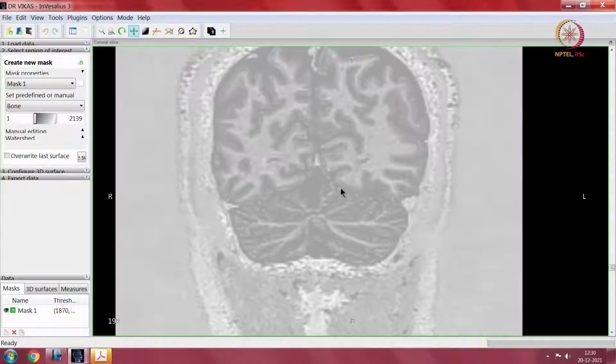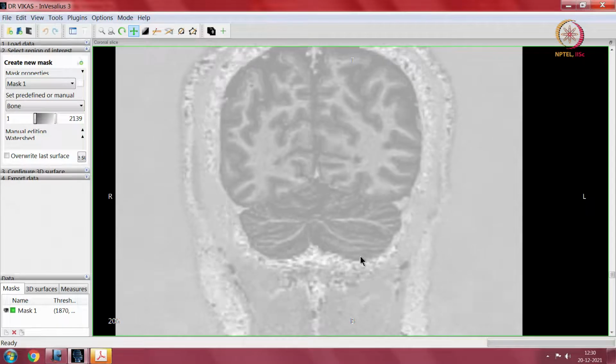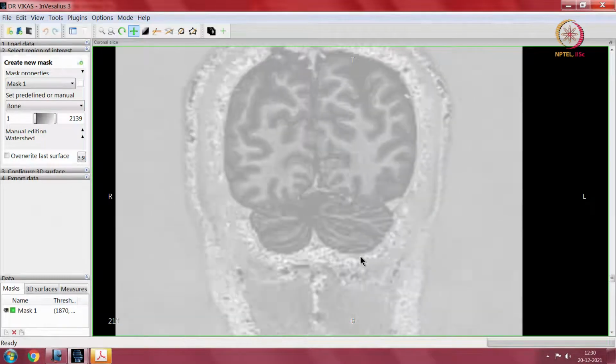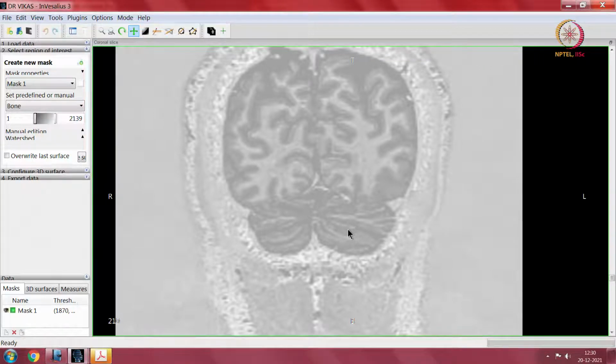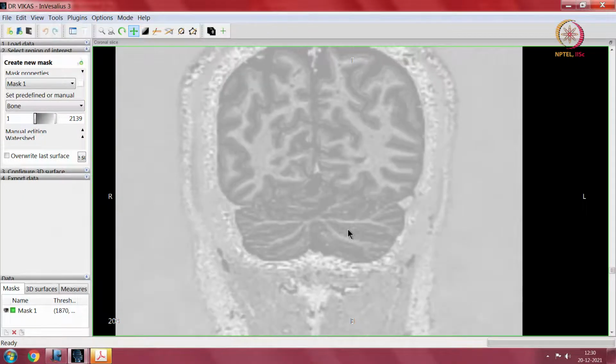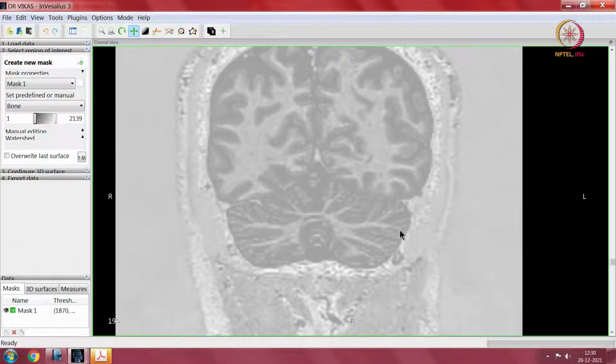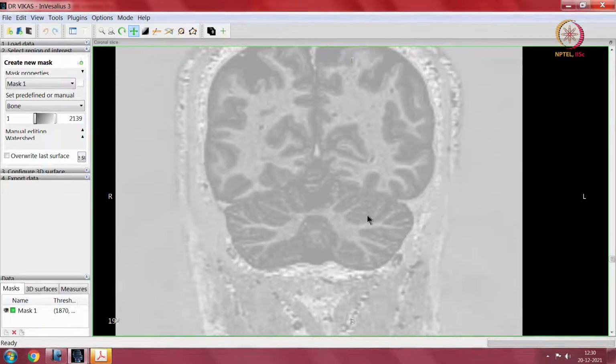So, here again we start from this, we are going from back to front. Okay. I have shown you, I did not describe anything from back to front. This is the left cerebellar hemisphere. Each of these frond-like structures, you can make out that it is looking like leaves of a tree. Each of these is the cerebellar folia. The foliar architecture is very nicely seen over here.